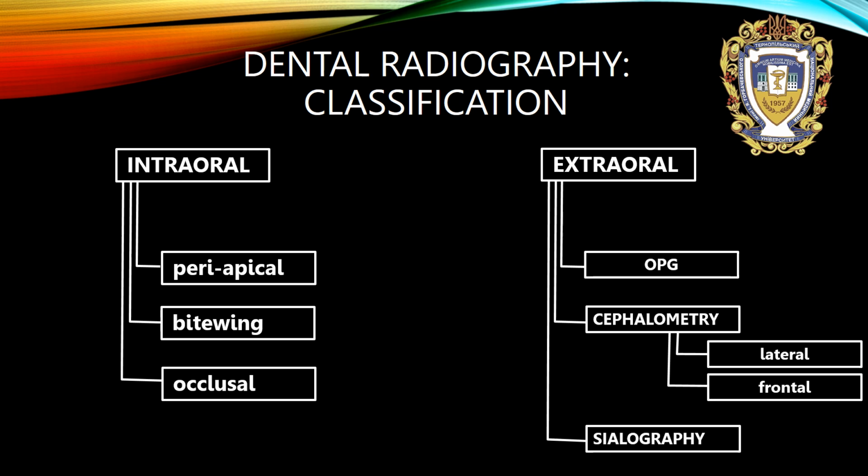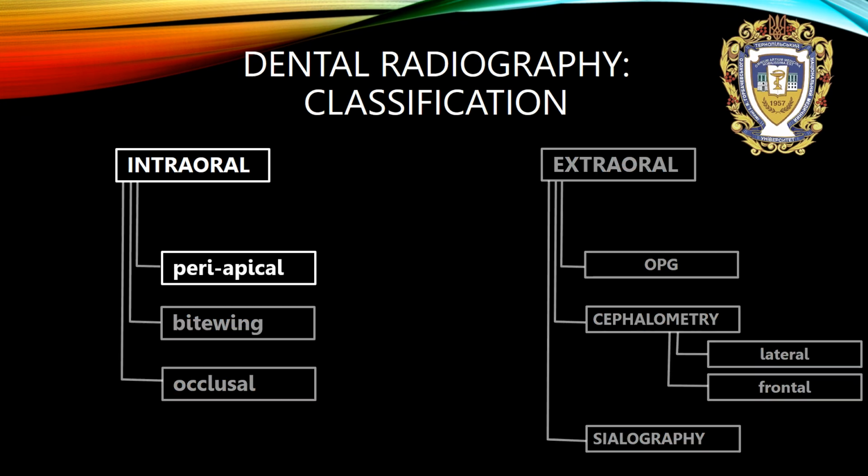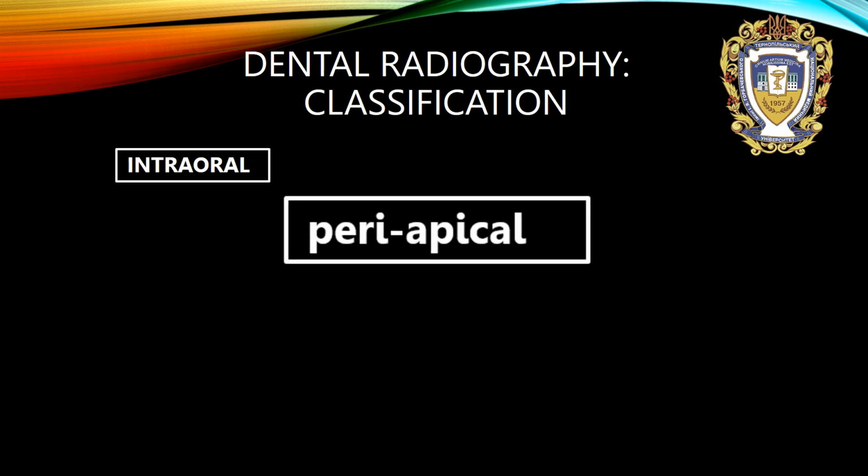Let's talk in detail about every type of dental X-ray. The first one is the intraoral periapical X-ray.